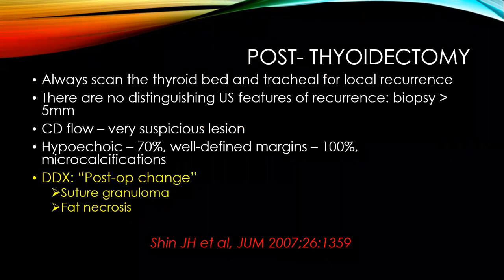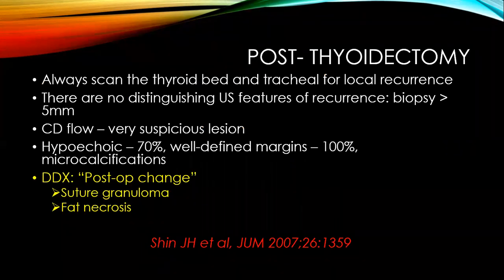It is also important for us to talk about ultrasound assessment of the neck post-thyroidectomy. So we always need to scan the thyroid bed and we need to scan the trachea for local recurrence. And unfortunately, there are no distinct ultrasound features of these recurrence nodules. But if we get any nodule that is greater than 5 millimeters, it is advisable to biopsy that nodule and send it for fine needle aspiration cytology so that we rule out recurrence.